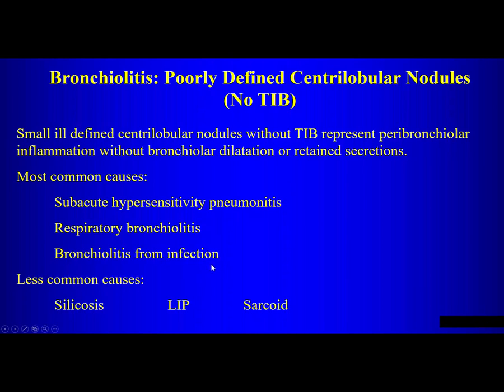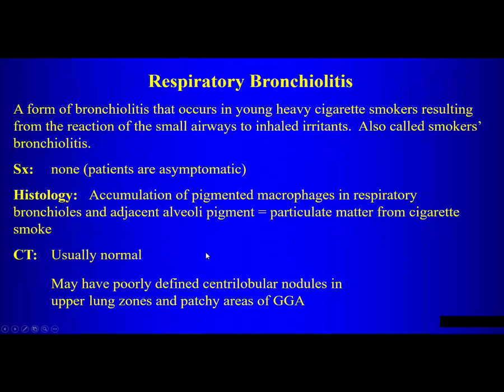You might also see that with respiratory bronchiolitis, although occasionally bronchiolitis from infection can also give you centrilobular ground glass opacities without tree and bud. Rarer causes are also listed here.